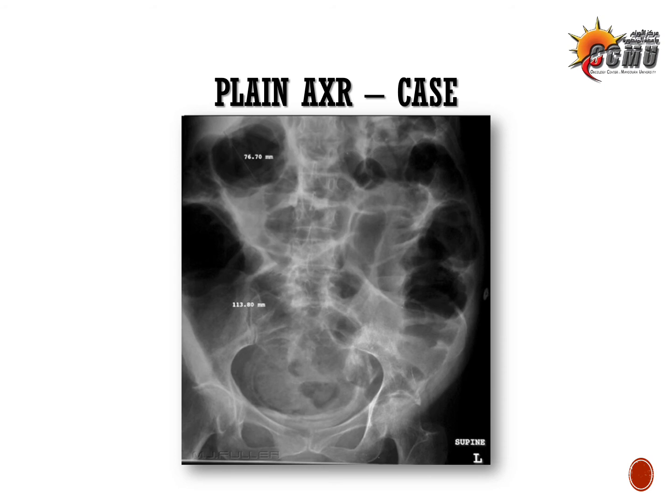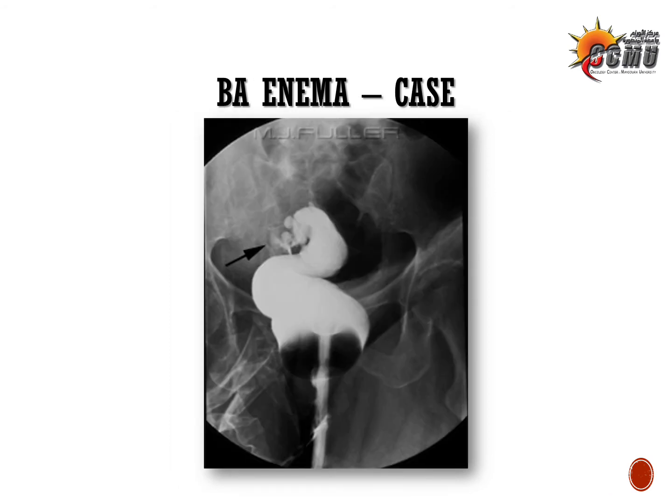Actually, this case is a case of large bowel obstruction, and when we followed up with this patient with further investigations, he underwent barium enema, which is seen here. So this is no longer a plain X-ray. This is an X-ray with dye, and as you can see, the barium takes the whitish shadow or whitish density.